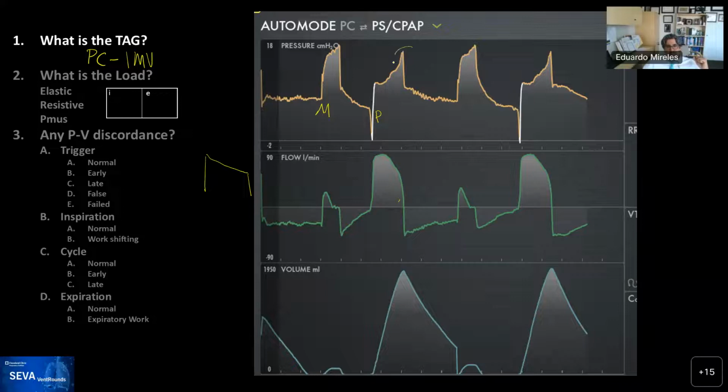And many people get confused by this peak here. But that's another manifestation of how mediocre the ventilators are at controlling pressure. This is because the flow is now changing direction. The patient is starting to increase the impedance of his chest wall. He's starting to move air out, and the ventilator was trying to keep the pressure at some level, and now it sees all this pressure, so the pressure elevates.